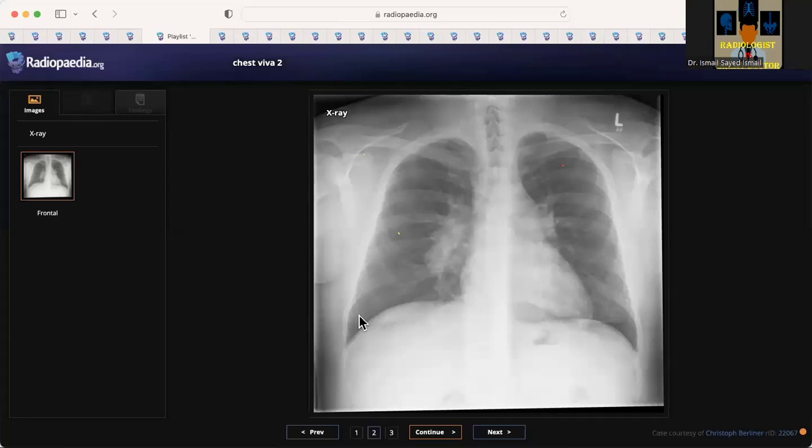If it is a new patient, I would advise CT, and if it is an already known patient, I would compare with the previous images. If it's a fresh case, then I would proceed with the CT chest for this.